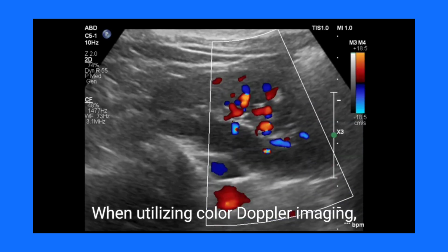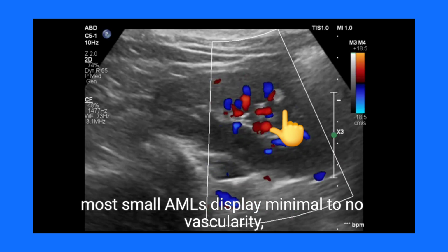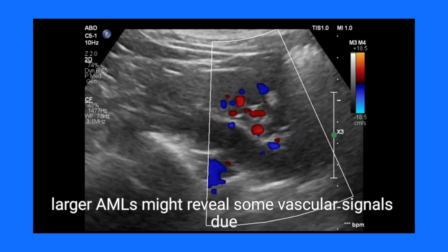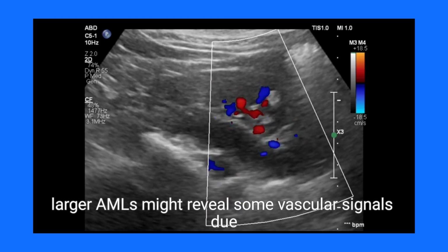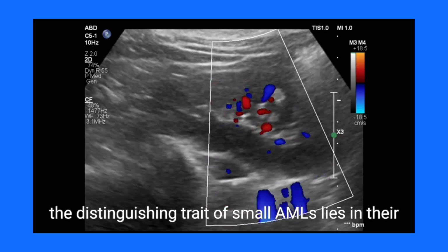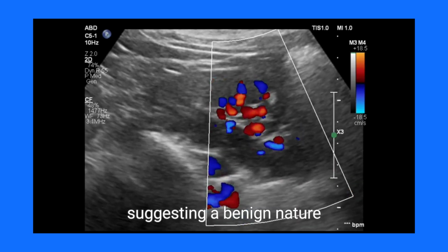When utilizing color Doppler imaging, most small AMLs display minimal to no vascularity, a key differentiating feature. In contrast, larger AMLs might reveal some vascular signals due to the presence of dysplastic blood vessels. However, the distinguishing trait of small AMLs lies in their typically avascular status, suggesting a benign nature.